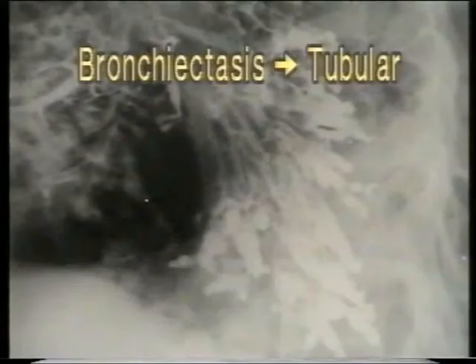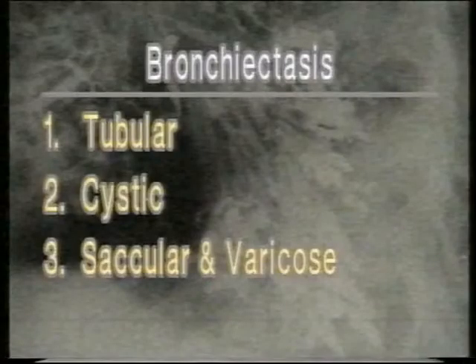However, for an absolute confirmation, it is essential to perform a bronchogram, which will also tell us the type of bronchiectasis and the extent and distribution of the disease in the lungs. In bronchiectasis, bronchi of one or more segments of the lungs are dilated and they are filled only up to 4 or 5 divisions as the distal bronchioles are occluded. Here we see a tubular type of bronchiectasis where the bronchi are uniformly dilated. There are 3 types of bronchiectasis seen on bronchogram: tubular bronchiectasis, cystic bronchiectasis, and saccular and varicose bronchiectasis.